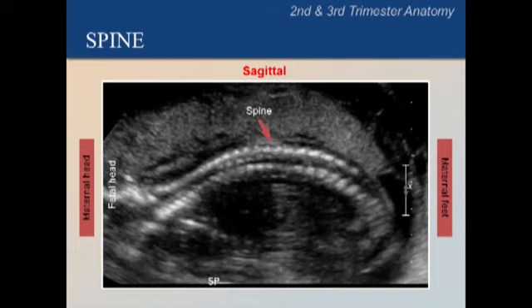What position is the fetus in? Please pause the video now to discuss as a group. The answer is that the fetus is a breech.